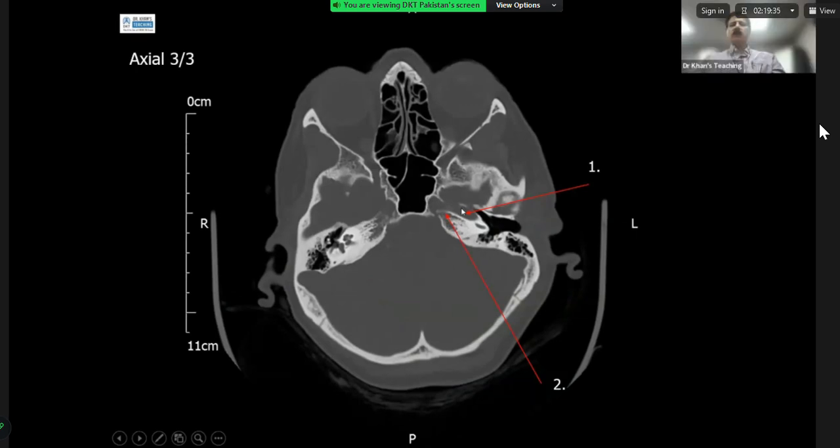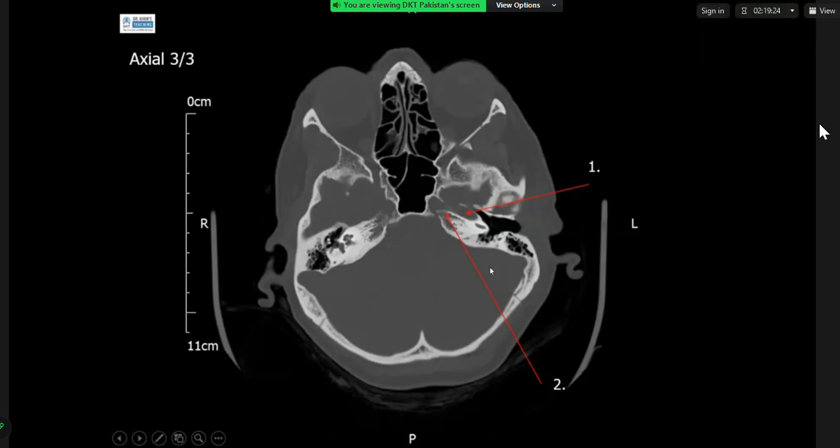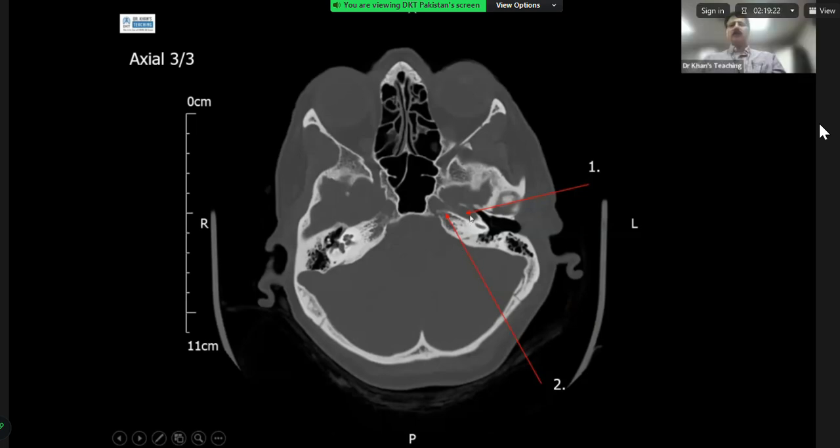It's a bit harsh because there is a bit of partial voluming, but there's a canal here. So what is this? It's not a continuation still of the carotid canal, no? Yeah. So this is the carotid canal, and this is the horizontal portion of the carotid canal.